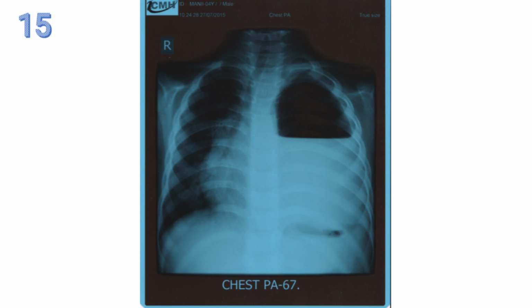There is a left upper radiolucent shadow without any bronchovascular margin, but in mid and lower part there is dense homogeneous opacity, and there is obliteration of cardiophrenic and costophrenic angle, and mediastinum is pushed to right side. So diagnosis was left-sided hydropneumothorax.